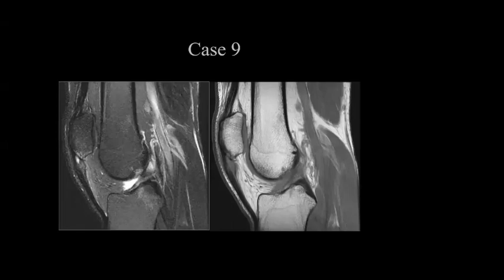Okay, so the history here is anterior knee pain. Anterior knee pain. Yes. My suggestion, doctor, is that for the ACL we may say partial tear or mucoid degeneration.